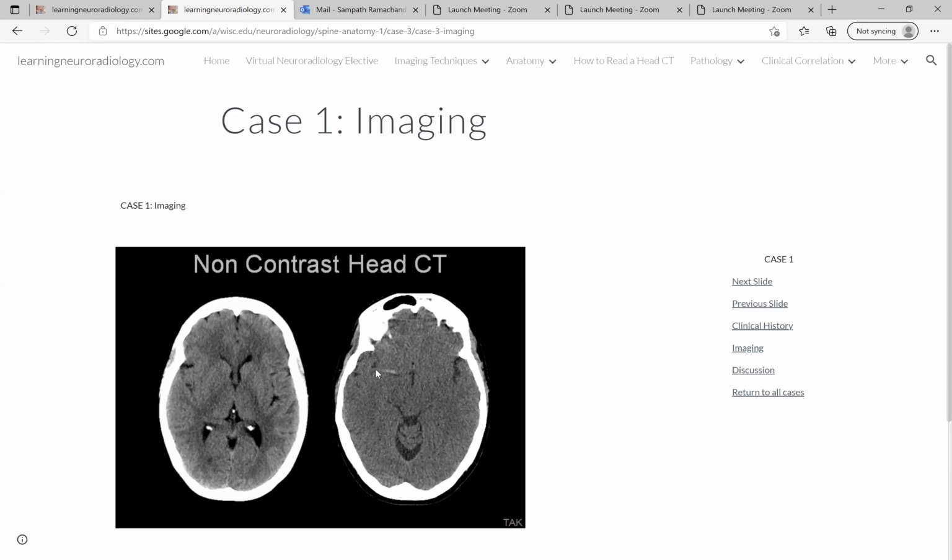this thrombus. So this patient needs immediate intervention, basically, to get this artery and this thrombus lysed. They take them to the suite and infuse TPA, which is a drug which helps to lyse the thrombus. So this is actually a critical thing to find in a CT of the head.